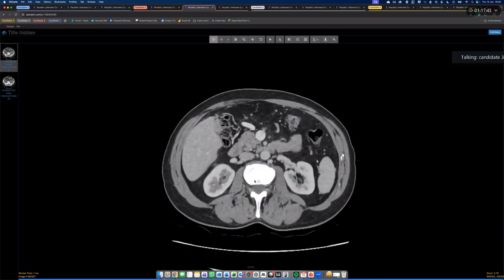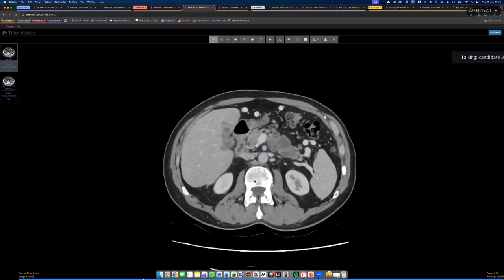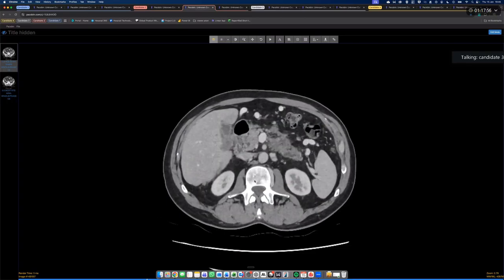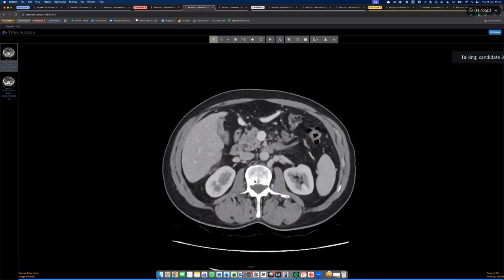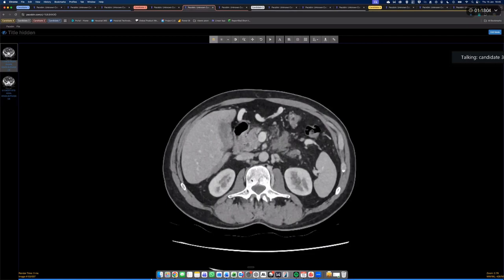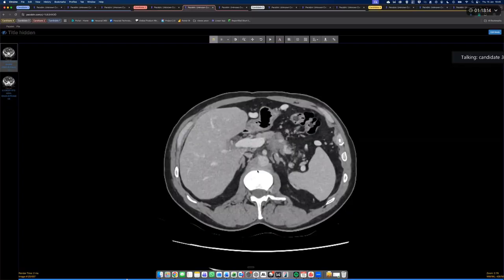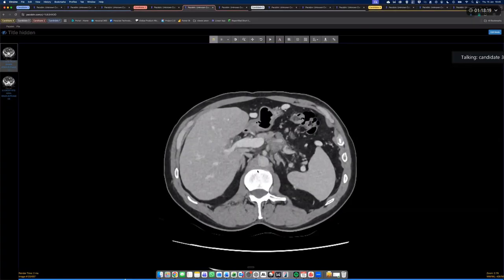CBD also appears to be normal. It's not dilated. I'm just looking at the gallbladder. There is also evidence of some hypoenhancing areas noted within the gallbladder. The gallbladder is minimally distended, however, the gallbladder wall appears thickened with some pericholecystic edema, which could be reactive. I would like to trace the portal vein in its entire segment.